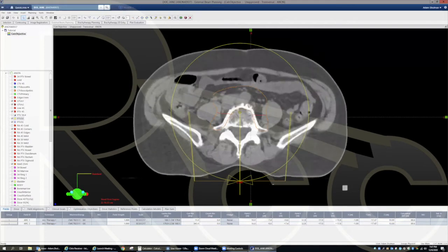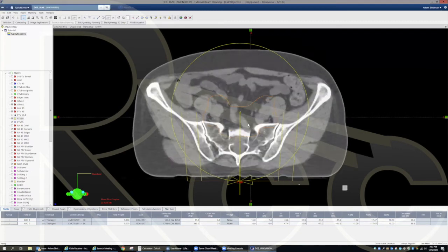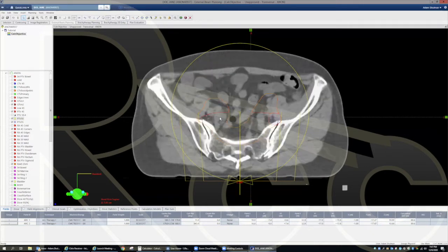You don't tend to contour much above and below your PTV? No. Yeah, great. So I pretty much rely on organs as they are. Like I said, in this case, I did cropped organs, but you can do the same process without even cropping. You should get the exact same results. So I like to focus on just the optimizer working and trying to limit how many conflicting arguments there are, and focusing on these little areas where I think it'll need help in advance.